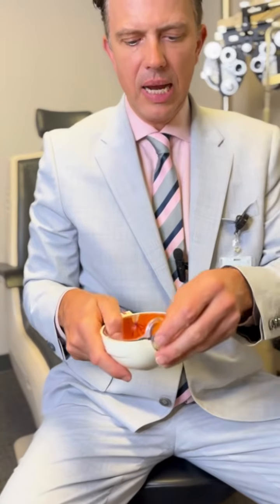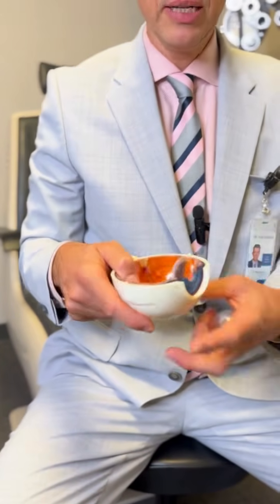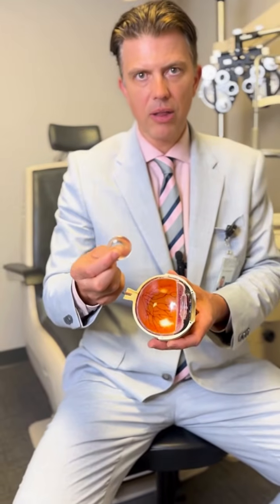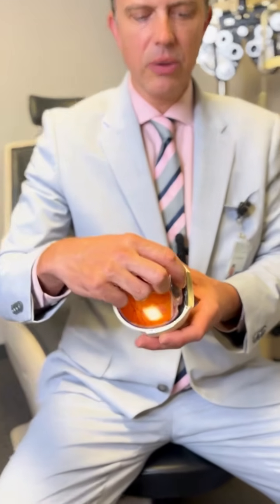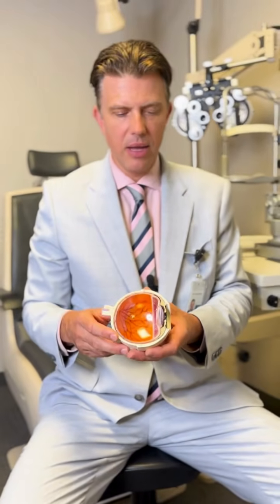Well, we're not taking anything out of your cornea or changing that. We're not changing your iris. All we're doing is actually just opening the sac of protein here to remove all the cloudy protein and replace it with a clear lens of your choice to refocus the light to land it in the back of the eye. This will help to open up the visual pathway and help you to have much better clarity long term, because now you have an artificial lens implant in your eye.